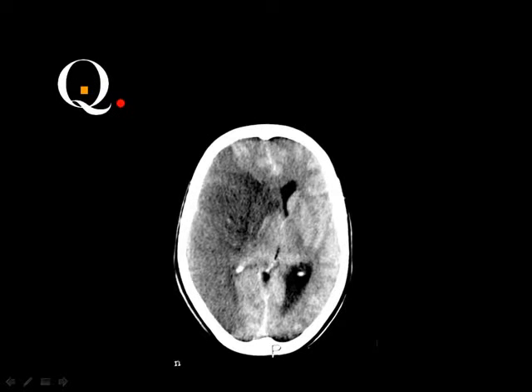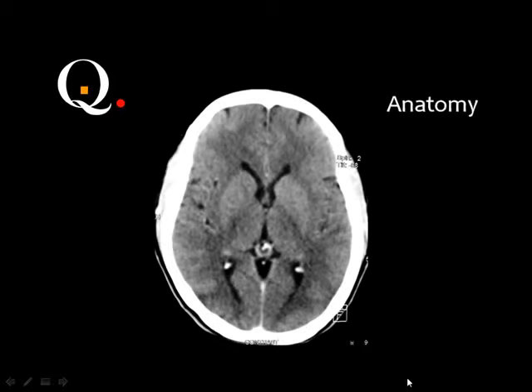What do you think of this? Yes, acute or subacute or chronic? Chronic. Acute, based on the ventricle adjacent to the infarction. This ventricle is not seen, you see the choroid plexus only, and this ventricle is relatively dilated. Then the infarction is compressing the ventricle on its side. This is acute infarction. Then we'll show you some of the anatomy.